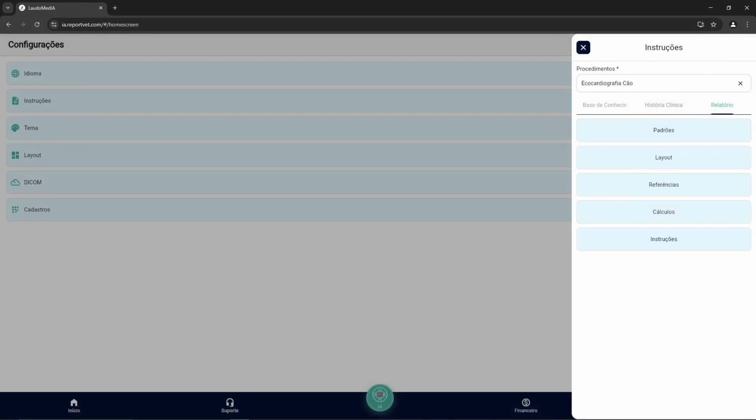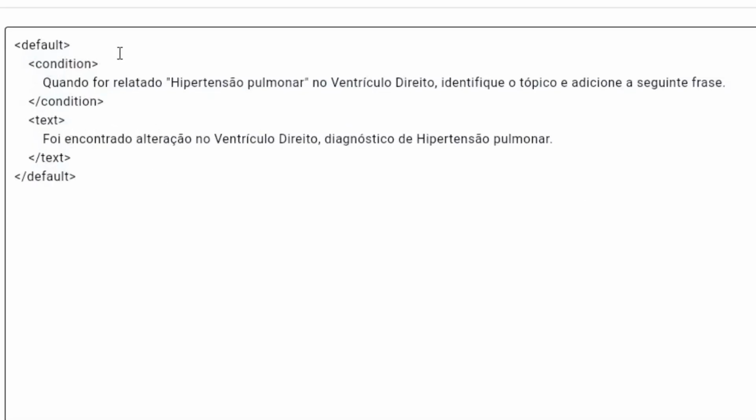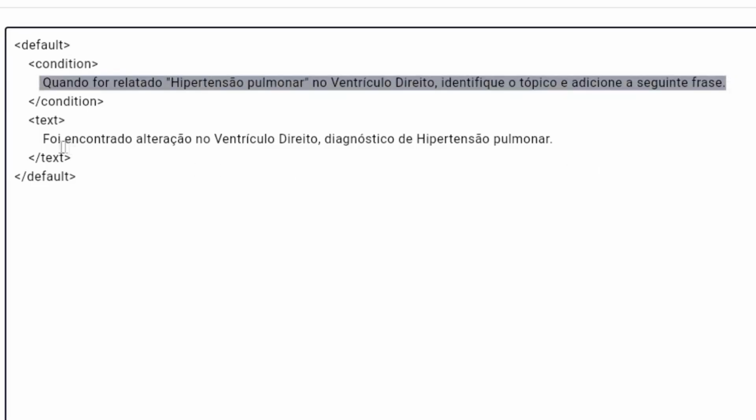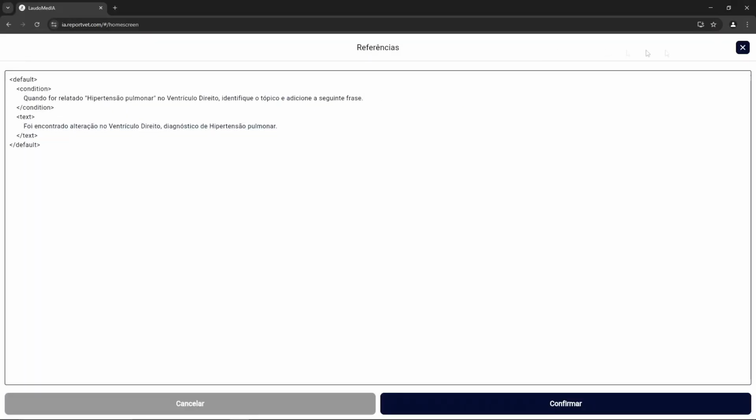However, you have the option to guide Lumini to use specific texts that match your daily reporting style. This ensures that your reports maintain their structure and formatting. If an abnormality is detected, Lumini will use your predefined texts instead of generating new ones.